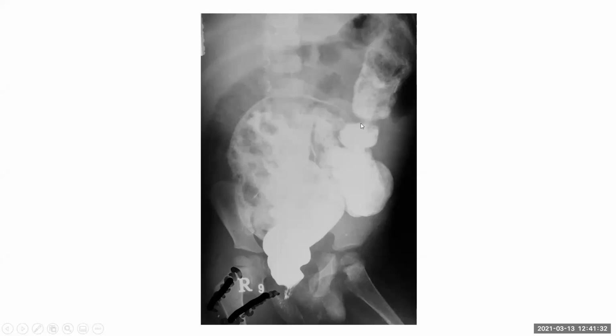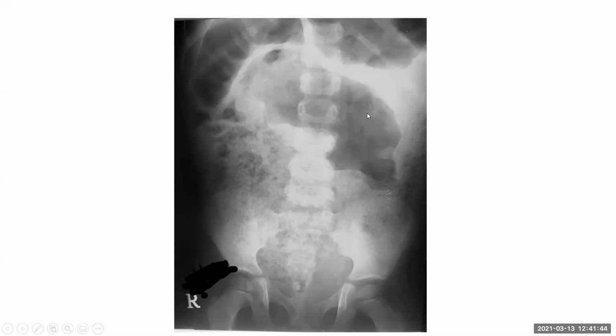Yes, I told you, this is a contraction. If you have other views, then you can always see whether this contraction opens up or not. Yes, this is actually a contraction. And on the plain film, you were very right. This is a part of the sigmoid colon, and this mottled appearance is always the fecal matter mixed with air, right?